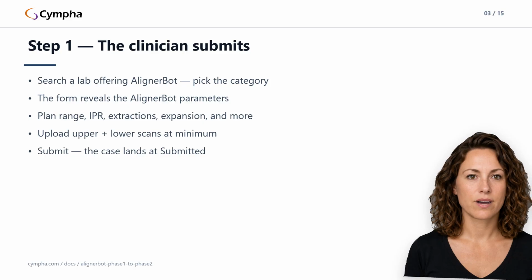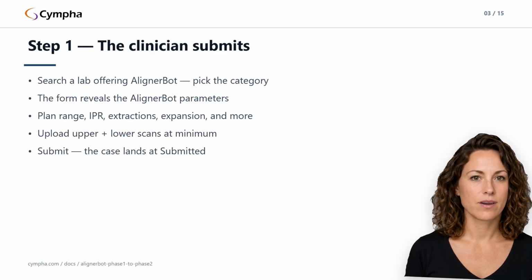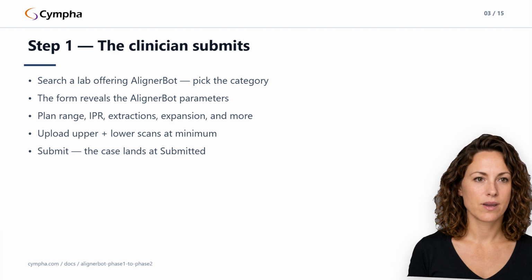They upload at least the upper and lower scans; bite, photos, and CBCT are optional extras; and submit. The case is promoted from a draft to submitted, held by the lab manager, who gets an email from Cympha. There's a focused intake guide if the clinician side is your whole interest.